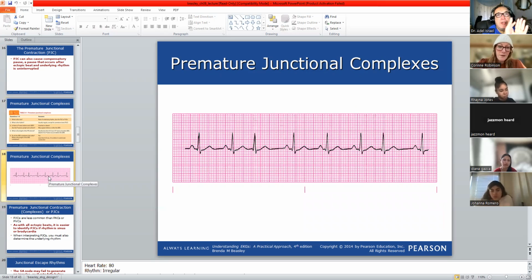Okay, don't look at the header. Let us check our knowledge together. Whoever is fresh can go by this strip. And when I say go by this strip, follow the rule. What is the rule? What are the 5 steps? I need one of you to start with me, please.